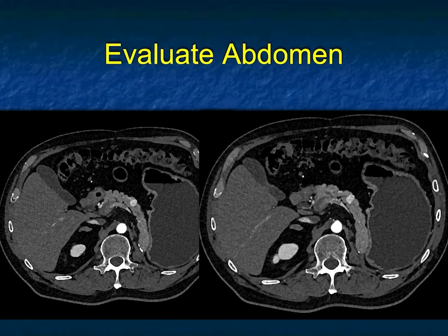If the patient did not have a left nephrectomy, I would look at this and say, this is a neuroendocrine tumor. Neuroendocrine tumors are typically vascular in the pancreas, often don't obstruct the pancreatic duct. That would be a great diagnosis. But here there is a left nephrectomy, which means the patient likely had a renal cell carcinoma, typically a clear cell renal cell carcinoma, and this was metastatic disease to the patient's pancreas.